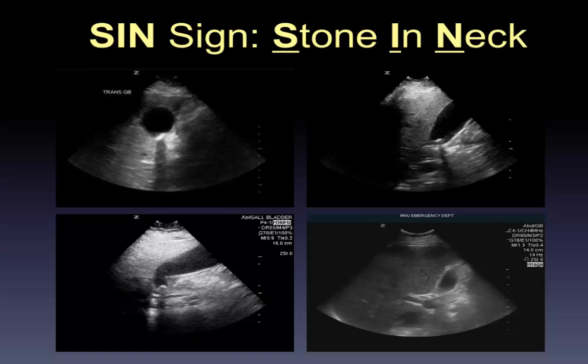Look for the stone in neck sign. So that is stones right in the neck of the gallbladder. Very important to check out the neck. Neck stones tend to cause more symptoms and are more likely to cause cholecystitis, but they're also easily missed.